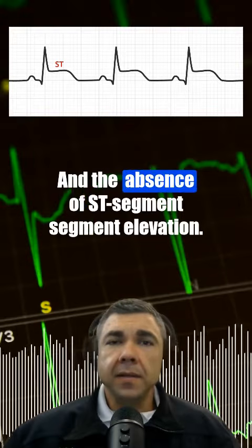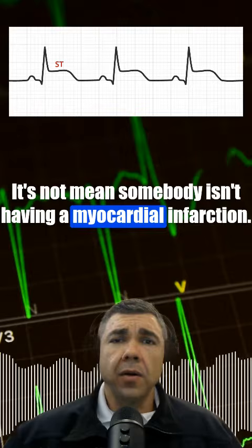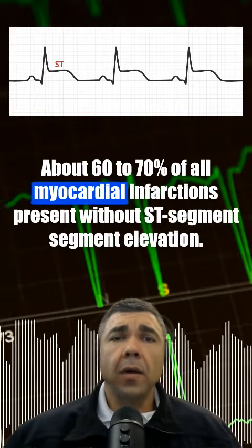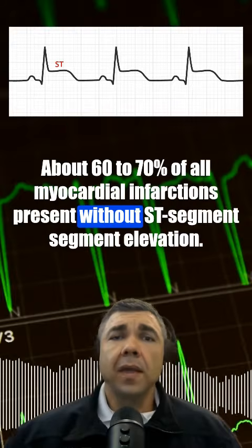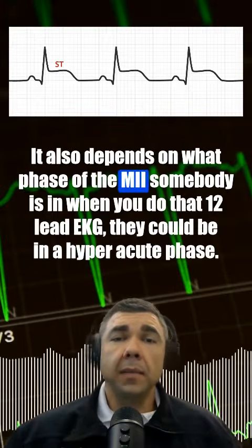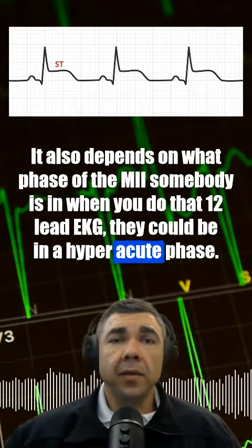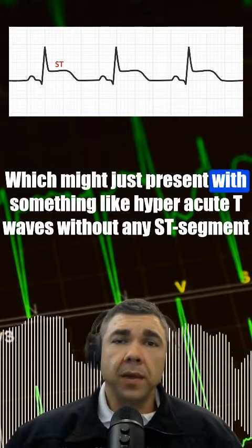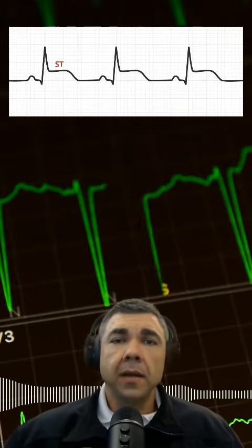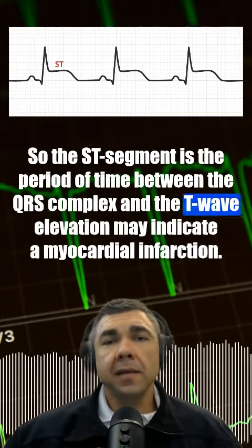And the absence of ST segment elevation does not mean somebody isn't having a myocardial infarction. About 60 to 70% of all myocardial infarctions present without ST segment elevation. It also depends on what phase of the MI somebody is in when you do that 12-lead EKG. They could be in a hyperacute phase, which might just present with something like hyperacute T waves without any ST segment elevation.